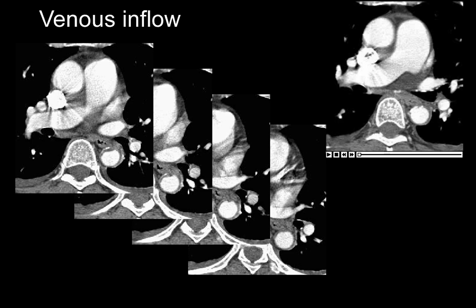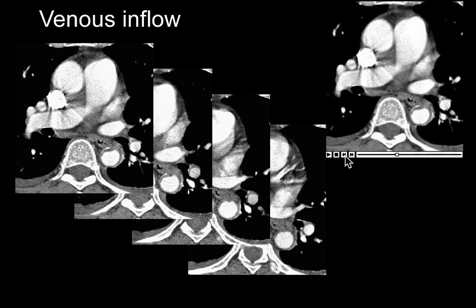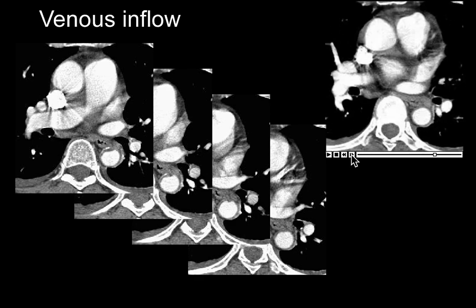Occasionally, an unexplained drop in the concentration of contrast in the artery is mistaken for a pulmonary embolus, as is seen here in the left lower lobe pulmonary artery. The decreased concentration of contrast is not as striking as that seen with pulmonary embolus, and is homogeneous throughout the cross-section of the artery, usually seen on only one, or at most two, contiguous slices, as seen here. This is thought to be due to poor mixing of blood and contrast in the right ventricle.